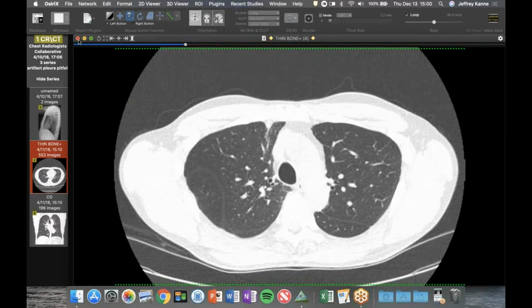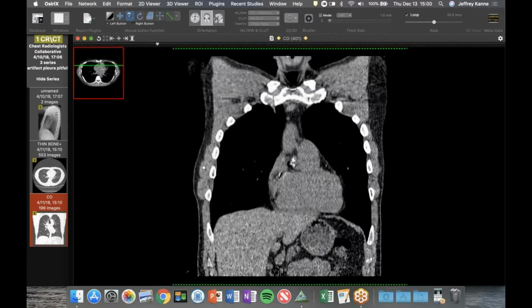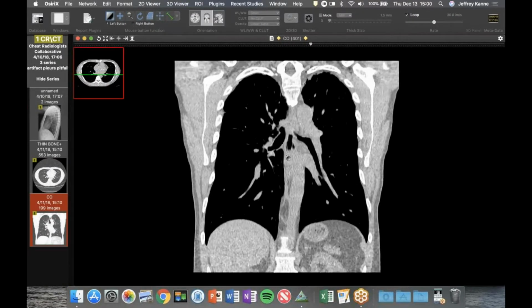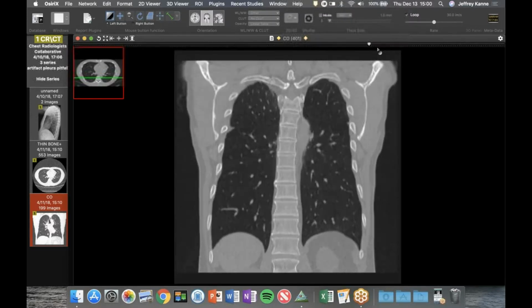I was investigating fresh cadavers for a while back in my Duke days, looking for these anatomical correlations. And it's just amazing. You can pick up the parietal pleura on the diaphragm, and you can just pull it up with your fingers and stretch it. It's very, very stretchy. Mm-hmm. The pleura has to be stretchy because the lungs are expanding all the time. Things are moving around. So extrapleural, the parietal and visceral pleura are nice and stretchy, and therefore it's easy to suck fat into the fissures. Mm-hmm. And this is a very nice example.